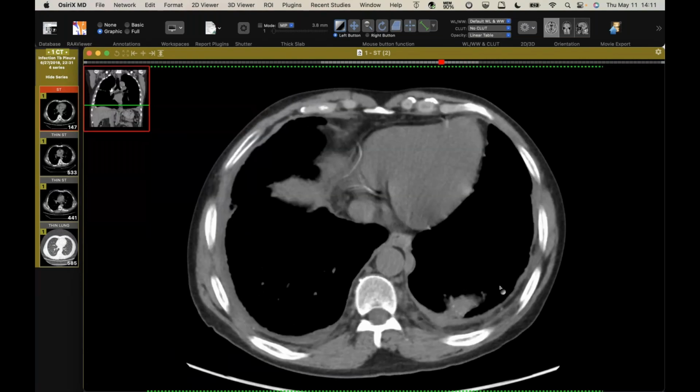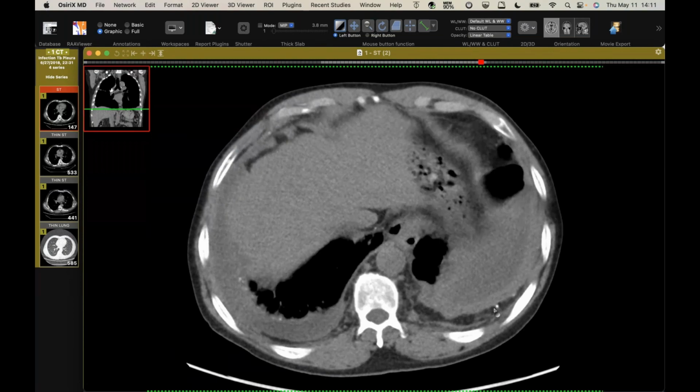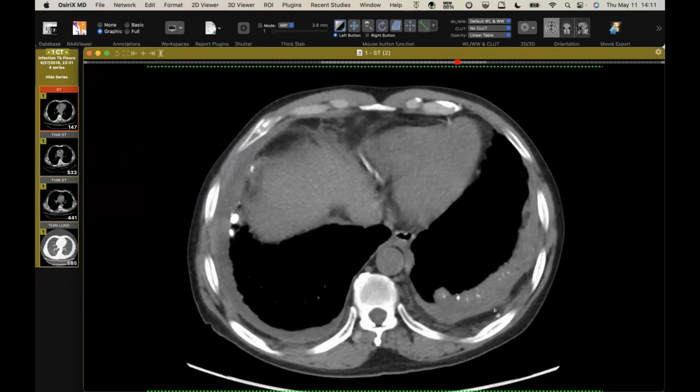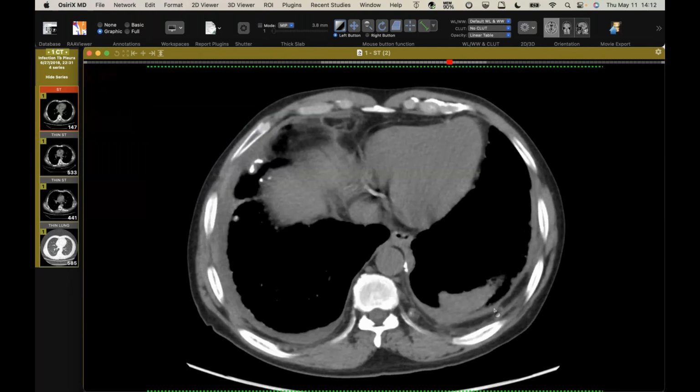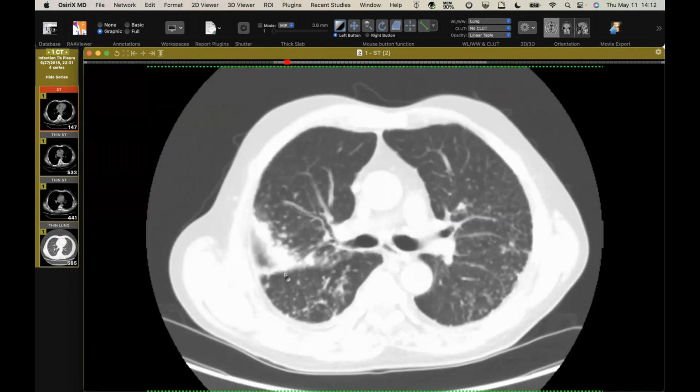So acting like, and you see hypertrophy here of the extrapleural fat, so some chronic inflammation. So you always think about malignancy with a new effusion. You can also think about a chronic infection. You can think about autoimmune disease. Of course, sarcoid is immune related, but the patient didn't have any other autoimmune disease. And the sarcoid itself, there was a little bit more conglomeration of these nodules up there.